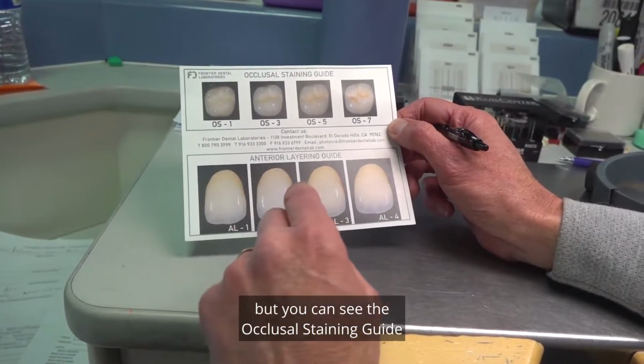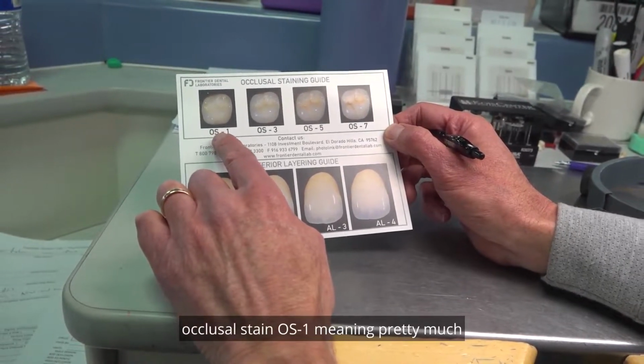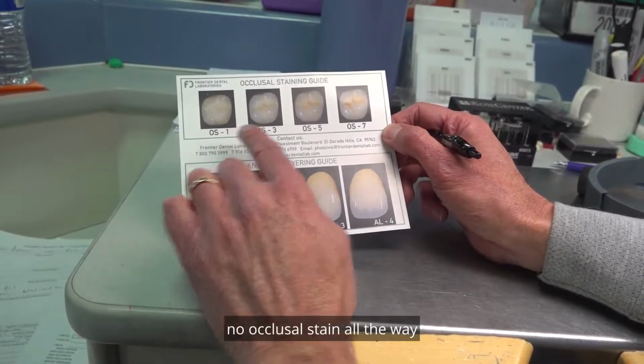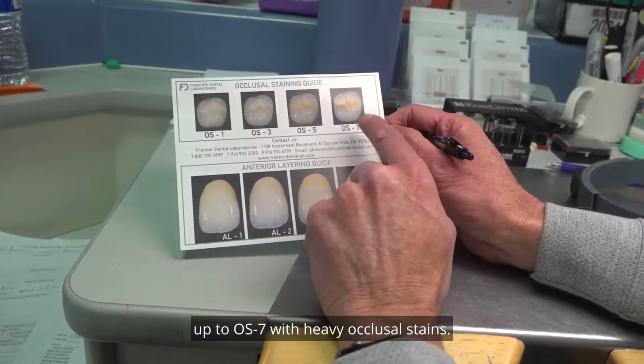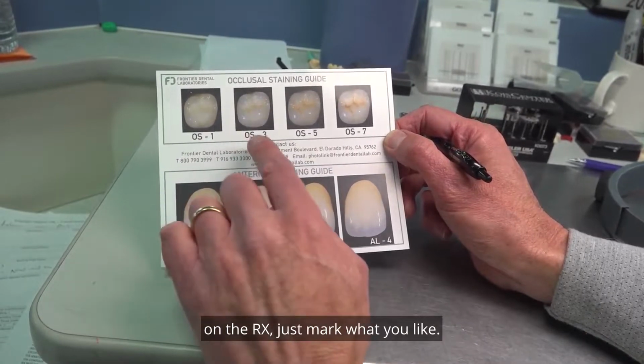But you can see the occlusal staining guide for the posteriors. You can reference what you like as far as occlusal stain. OS1 meaning pretty much no occlusal stain, all the way up to OS7 with heavy occlusal stains. So it's kind of nice to have these things in your operatory, and we have a bunch of these things. And just on the RX, just mark what you like.